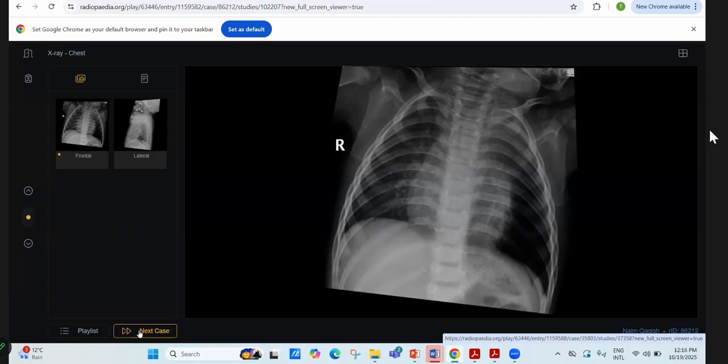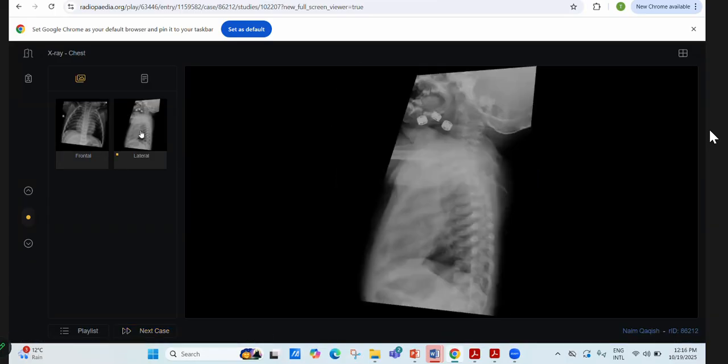So, considering the history of acute shortness of breath in a young patient, and with this X-ray finding, my first priority would be to rule out the possibility of foreign body inhalation. I'll immediately inform the physician, and I would also like to assess it on lateral projection if available. Some radiopacities are noted.